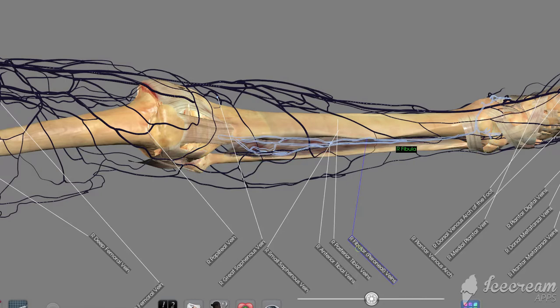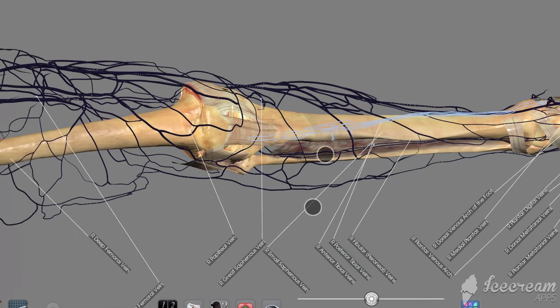Well, of course, each one of those has its own veins, just like arteries. So for the fibula, there's our fibular vein, which will be lateral since that bone is lateral. And then with our tibia, we've got two associated with it. These are going to be medial since that bone is to the inside. And there's our anterior tibial to the front and posterior tibial vein to the back. So one to the front, one to the back.